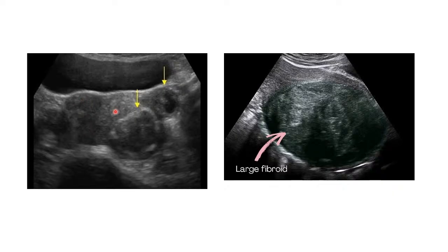It looks like it's also atrophic because these areas are very bright. And then there is another lesion here that is also appearing like another fibroid. And you also have another fibroid with a cystic portion, which is showing signs of degeneration.